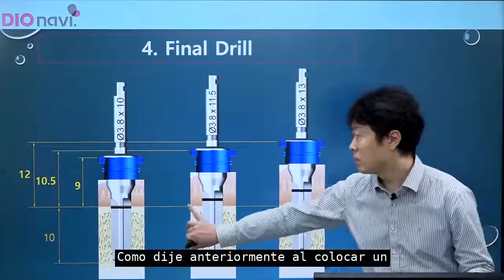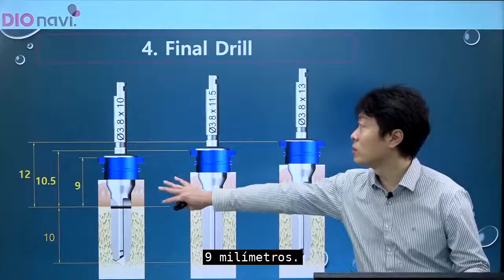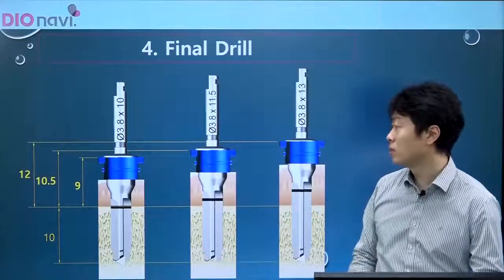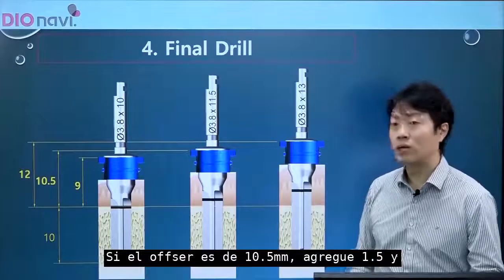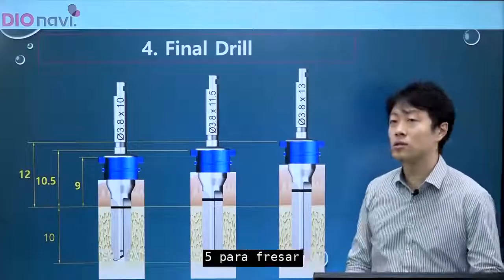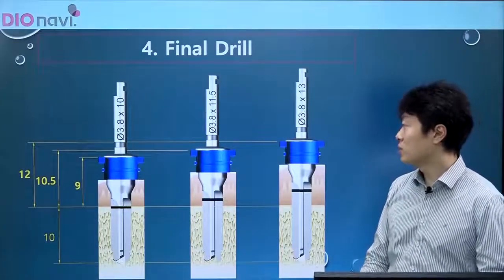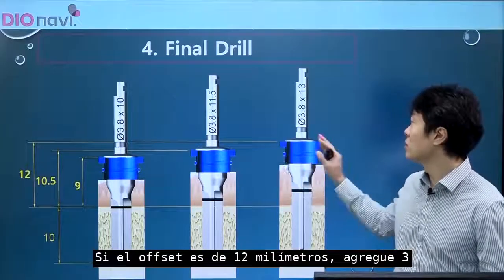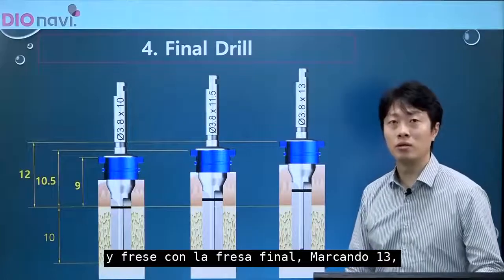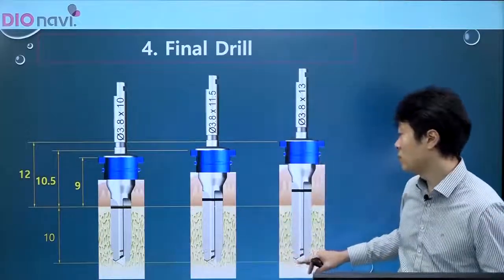As I said earlier, when placing an implant of 10 millimeters with the 9 millimeter offset, you should choose the final drill marked 10 millimeters. If the offset is 10.5 millimeters, add 1.5 and select the final drill marked 11.5 for drilling. If the offset is 12 millimeters, add 3 and drill with the final drill marked 13, and you can perform accurate drilling to the intended depth.